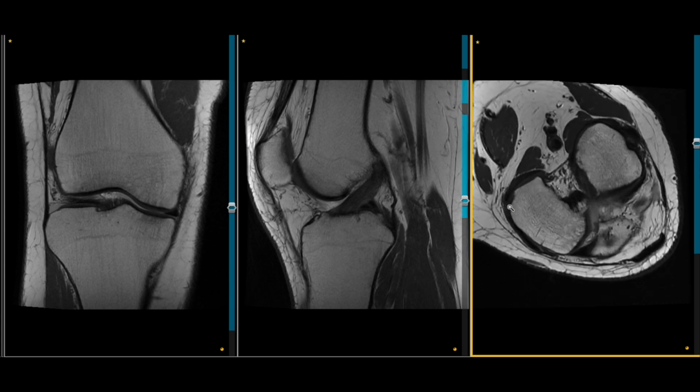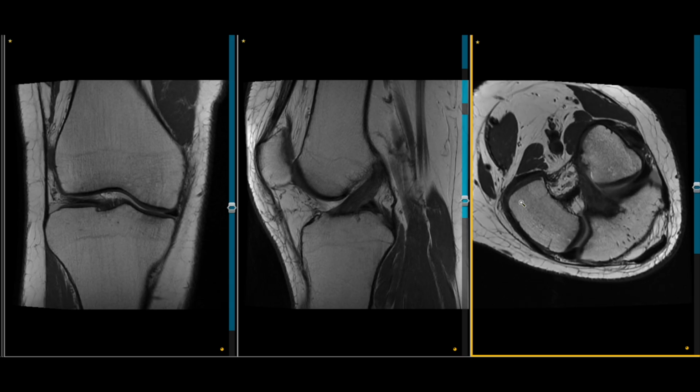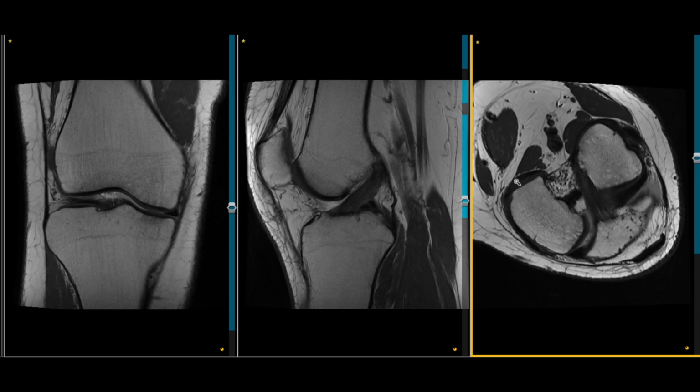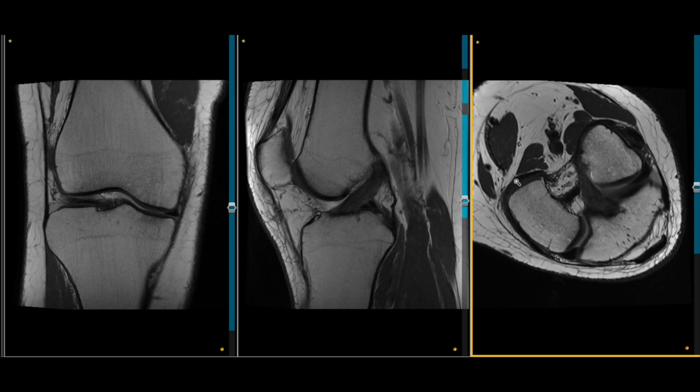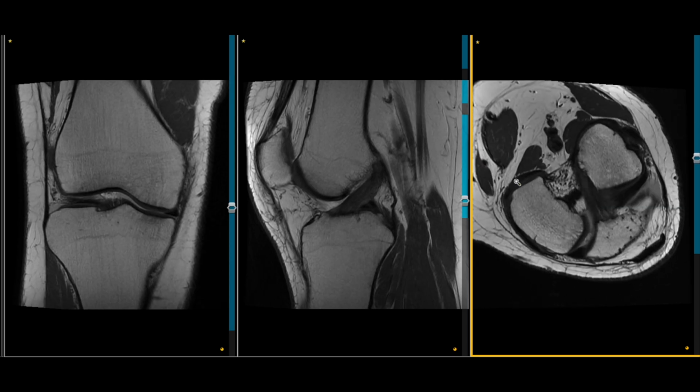This is also confirmed on the double oblique sequences where you get a nice view of the ACL from its femoral to tibial insertion point, again demonstrating that the ACL is of uniform thickness and uniform signal intensity along its entire length.